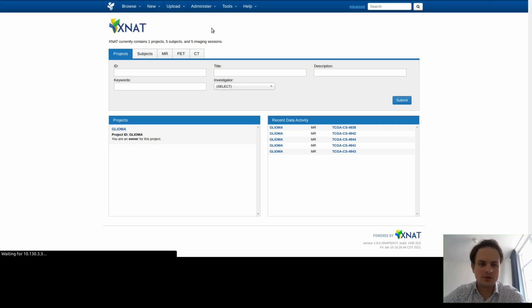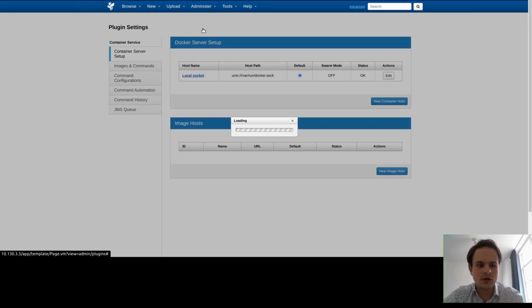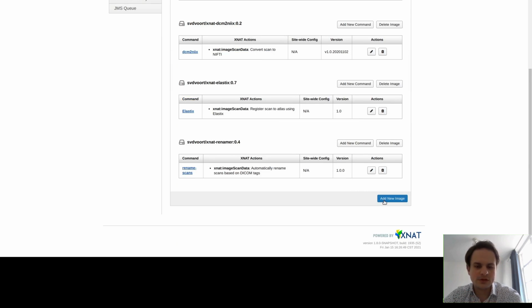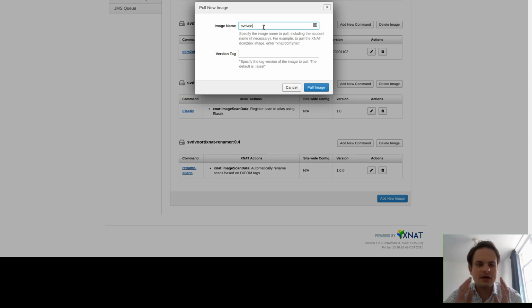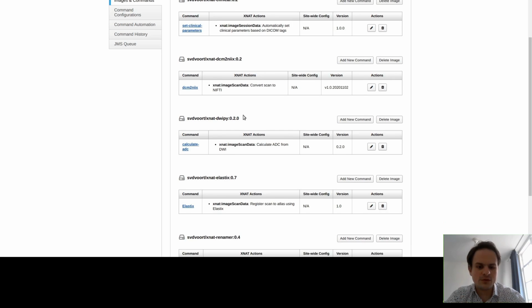These pipelines run in Dockers. This makes it very easy to install them, as they are already an environment that contains all the required tools and the commands. It is simply a matter of pulling the Docker image to the XNAT and waiting for it to install. We can specify the Docker name that we want and the version. This way we also have a version history and we know how the images were processed. We can now see that the pipeline is installed in the XNAT with a minimal amount of configuration steps.